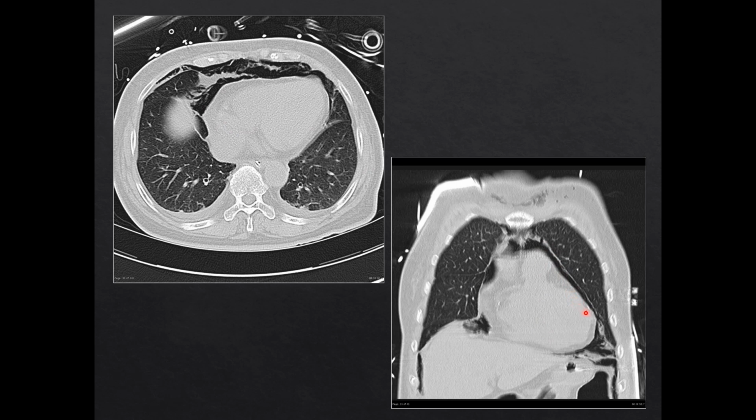This is trapped within the area of the mediastinum surrounding the heart. And if you look in this coronal view, that same air trapping is going around a significant portion of the heart. And if we were to scroll through this stack, you would be able to see that it actually travels up into the neck as well. CT, because of our ability to view it in 3 dimensions, just makes it a lot easier to catch those subtle findings than is the case with the layers upon layers in chest x-ray that can sometimes cloud the image.